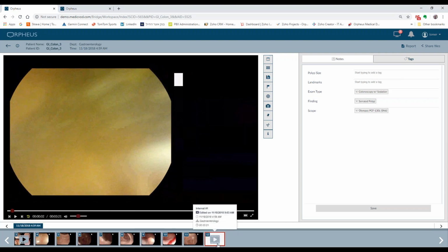Any edited video will always have this special icon on it. Now what I can do is select this video, or I can download it. Our default format, by the way, that our server always creates the videos in is MP4. If you know that there might be a need for other formats, you can see here we've activated, and this is a server-side setting, that we can activate additional formats, but we do not create them by default unless you specifically require them.